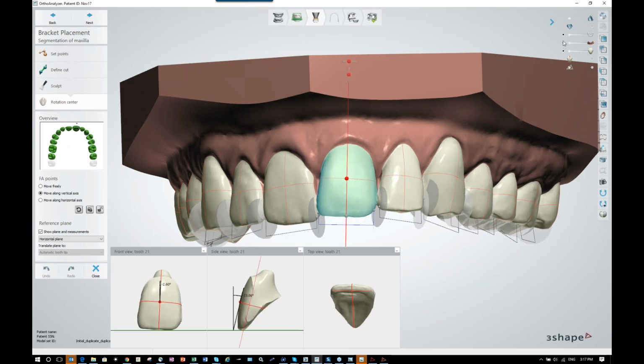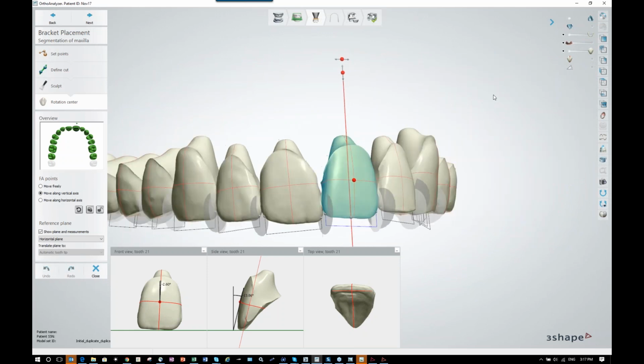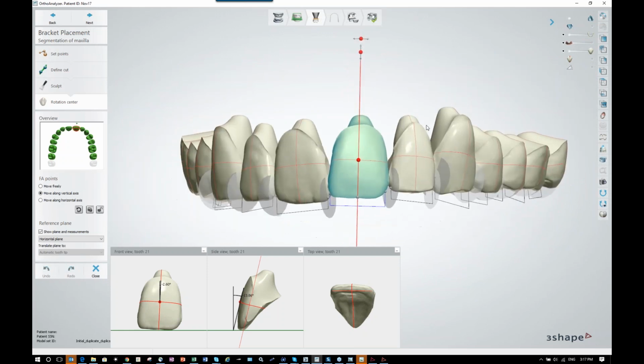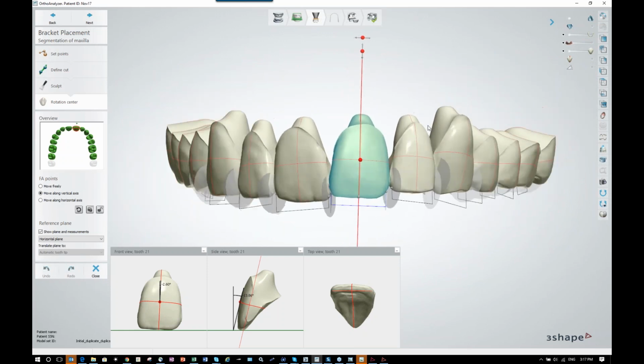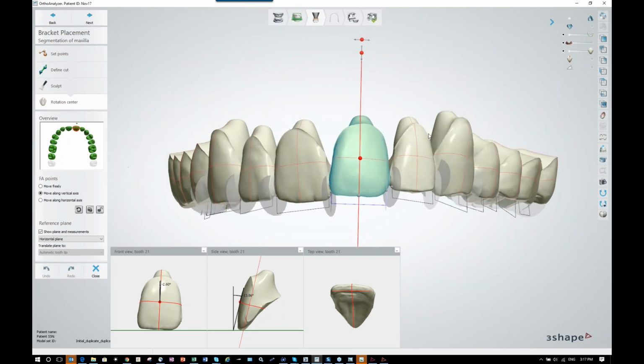And also, if you have the CBCT scan, it's now separated. On the sliders on the right side, I can remove some of it. So I want to remove the gums, if some of the technicians are just used to seeing the teeth. People who have been using CAD CAM before, so it gives you that option as well if you don't want to see the gums.